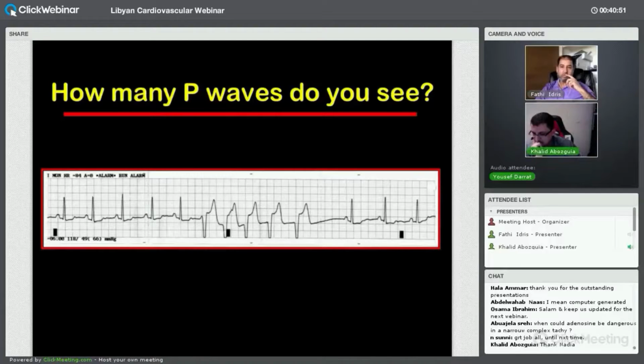That's very important. So search for the P waves. Do you see all of them or not? Because the diagnosis will be totally different if you don't look carefully, like the second case we showed. The P wave can be obvious or can be hidden somewhere else. So for all the next questions, think: where is the P wave hidden?